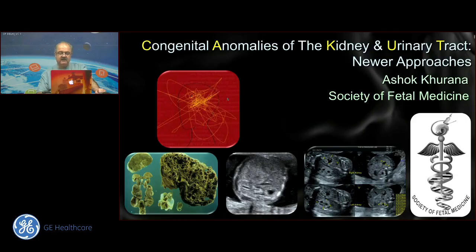seem to have got entangled between the old and the new, including things like classifications, which I will take you through. I will help you to understand that this is a normal kidney in transverse section, and so is this one. And of course, that when you look at this particular pattern, you can be absolutely sure that this is a recognizable pattern.